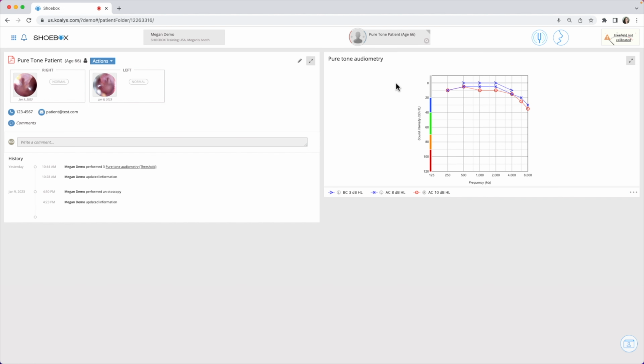We reviewed the 3 main sections of the pure tone testing page: how to configure your test settings and how to optimize your workflow using keyboard shortcuts. For more information on speech testing, check out our speech testing workflow video.